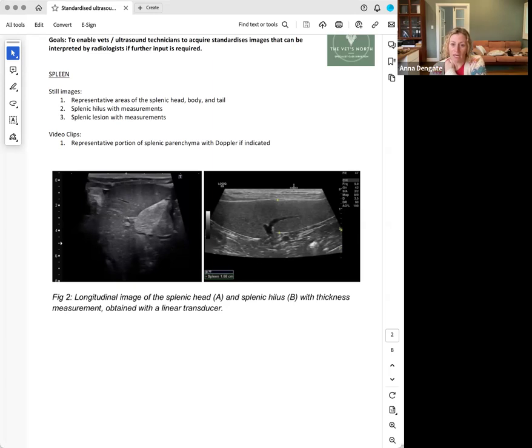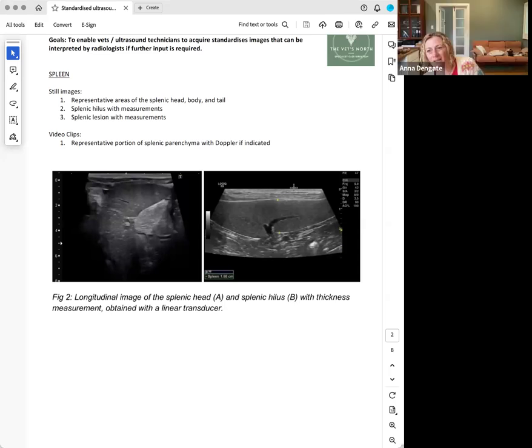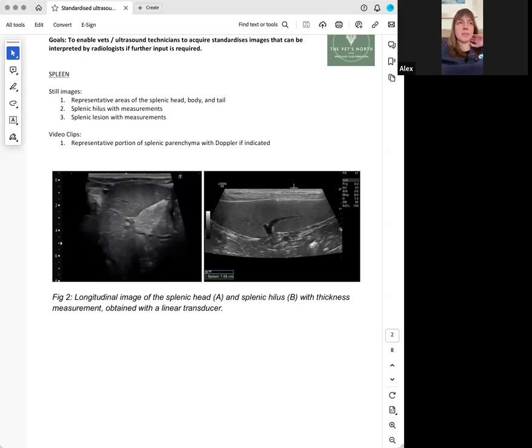I find it really hard to determine, everybody finds it really hard to determine the significance of a nodular spleen. What are the markers of nodules that we would be concerned about? If it's causing capsular distortion. That's my big one. Why? Because that's more of an aggressive behavior. Generally benign things kind of form to what's normal. They kind of seep in rather than take over.